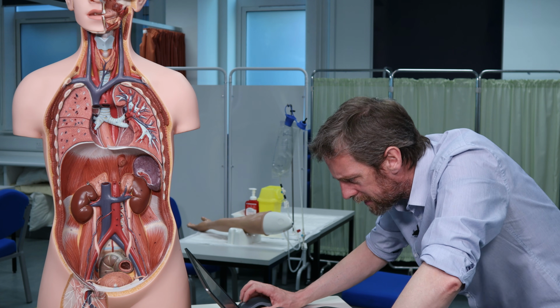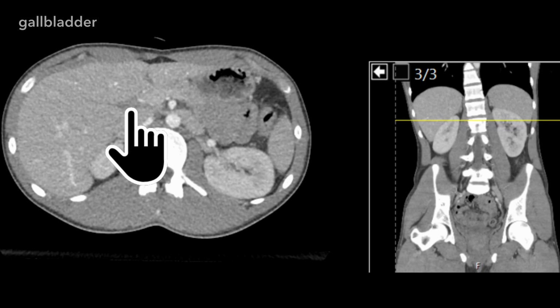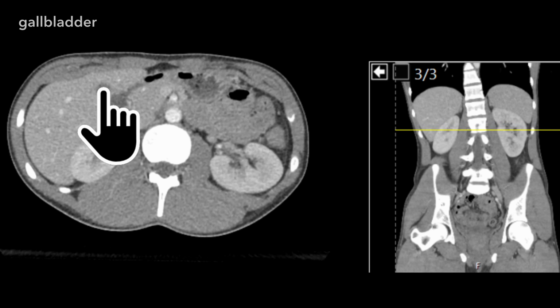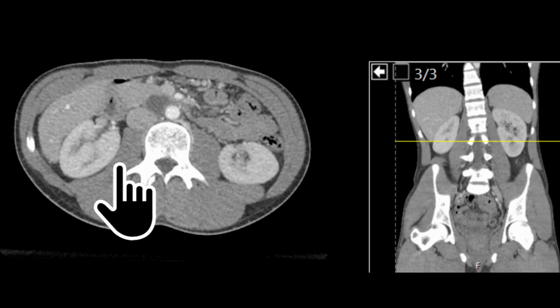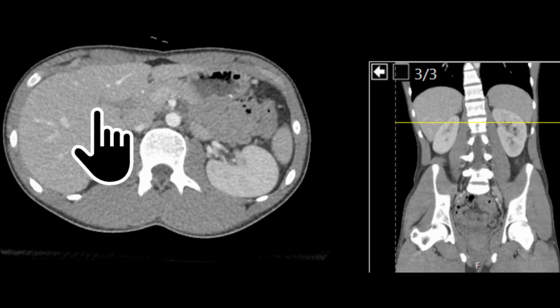So the other thing I'd like to see would be the gallbladder. The gallbladder nestles into the liver, right? And that's the sort of coloration we'd be looking for in a gallbladder. It's in the right place too. Oh, we can see, yeah.